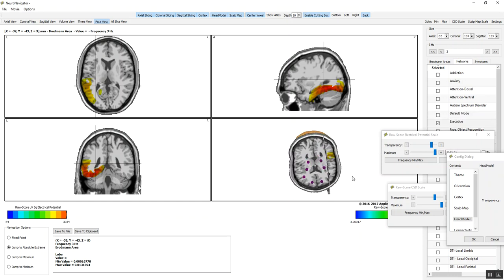So you can see these different aspects for this patient for both sides and see which regions seem to be affected, or which types of functions, based upon these networks here, which are based upon functional MRI and PET scans, several thousand of them, because of the Human Brain Mapping Program, with a few $1 billion dedicated.